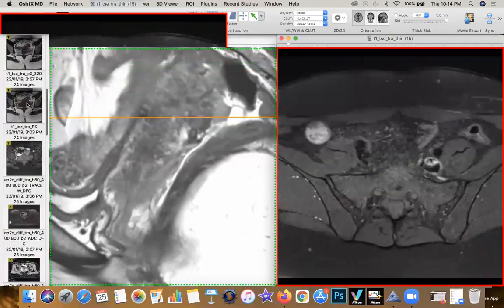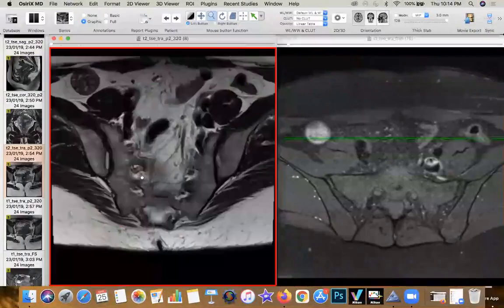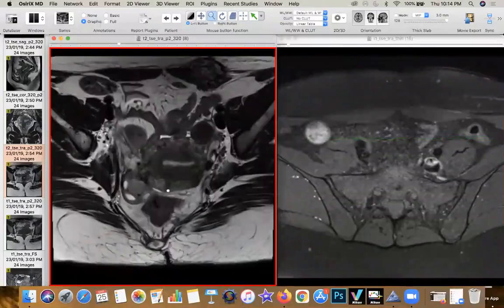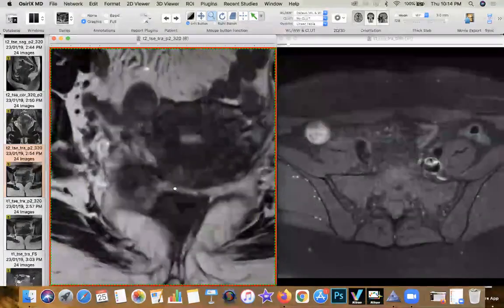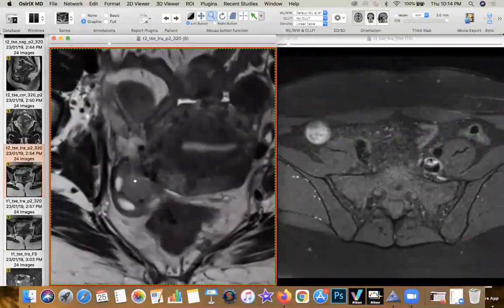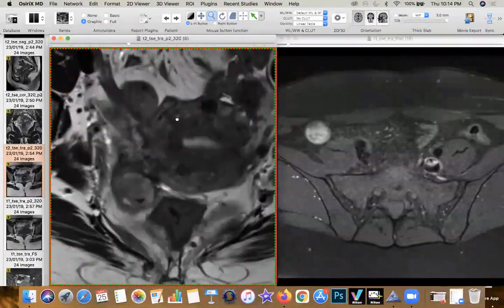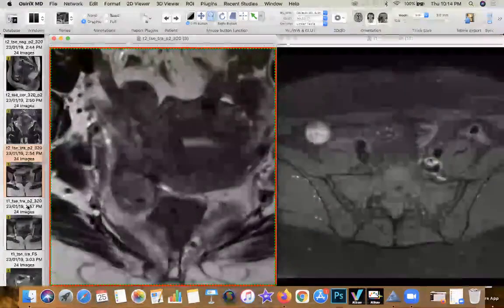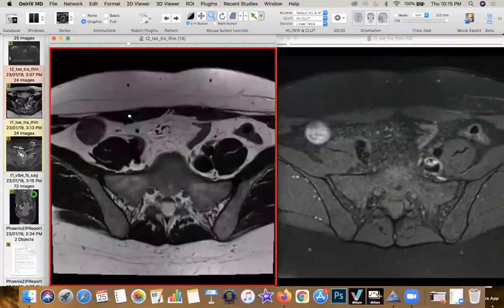Let's go back onto the standard T2 weighted images of the patient, axial, and voila, not only do you see black signal on the surface of the corpus, you now appreciate that the ovary is also plastered, and there's evidence of an ovarian endometrioma. So this is classic post C-section endometriotic tissue spilling out. But what else do we see? Patient had local tenderness in the left iliac fossa or in the area of the hypogastrium.